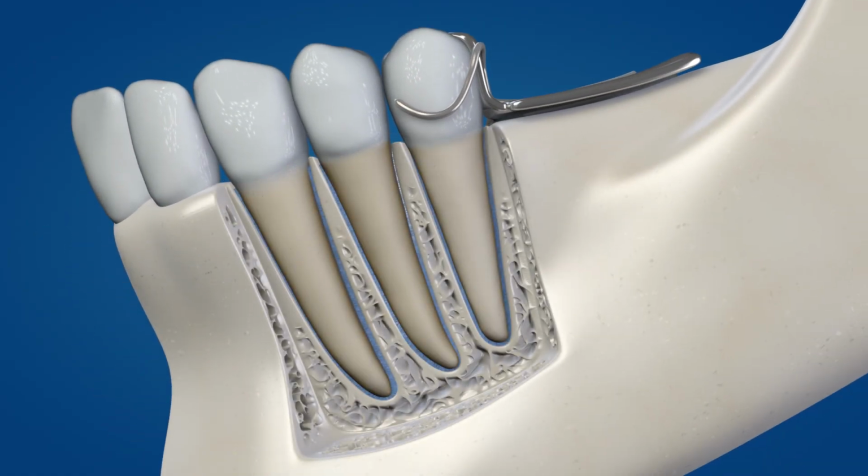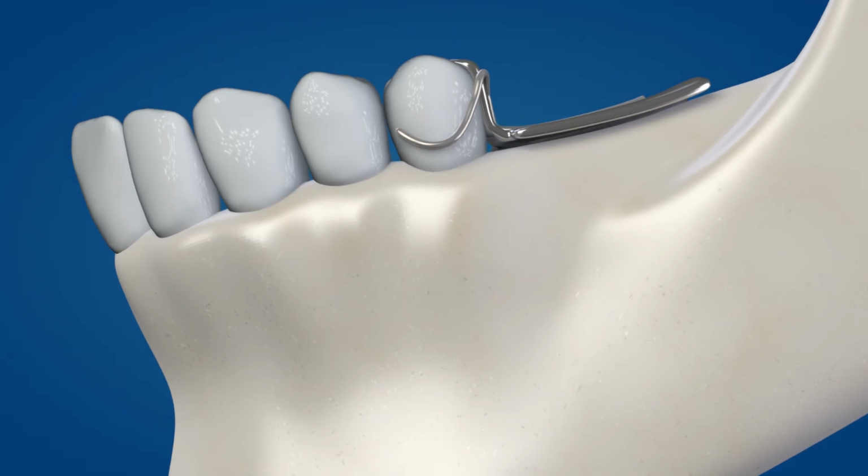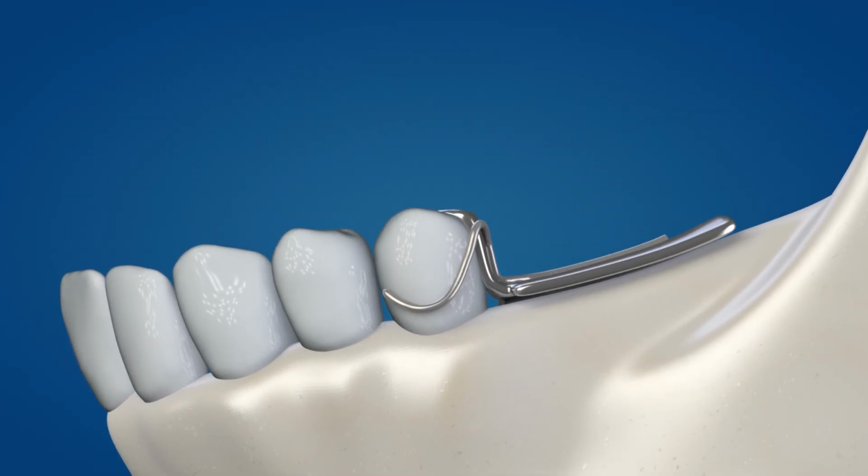Instead of applying torquing or rotational forces within the root, we observe a minor elevating force, and this force is well tolerated due to the orientation of periodontal ligament fibers that surround the tooth. The combination clasp assembly represents a viable method for clasping in extension base applications.